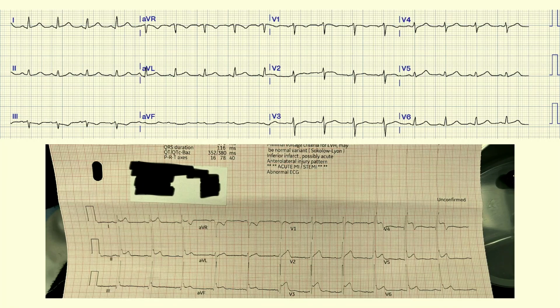No chest pain. Oh, no, actually, I take it back. He did have chest pain. And he got a cardiac MRI that was normal. He had serial troponins that were negative. The cardiac MRI read even went so far as to say no evidence of pericarditis. And by the way, this guy's ECG looks the same every time you see it. It's been the same for many years. That's his ECG. That's how it looks. He's a normal heart.